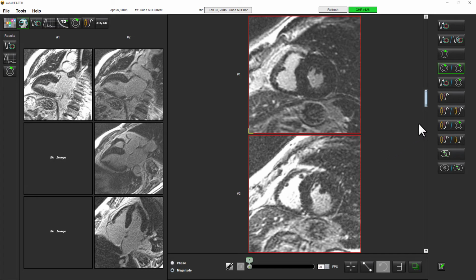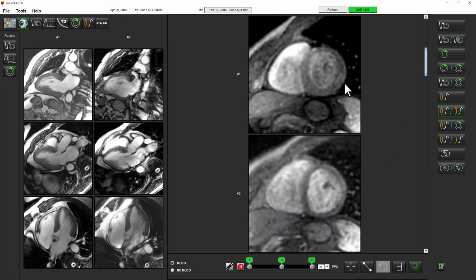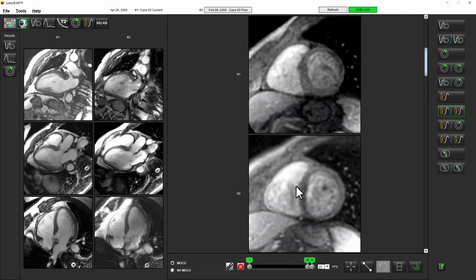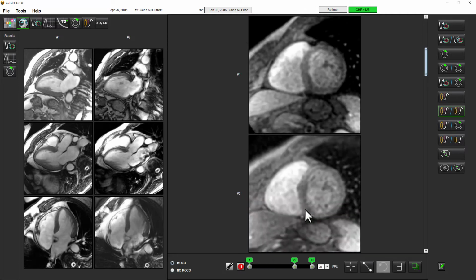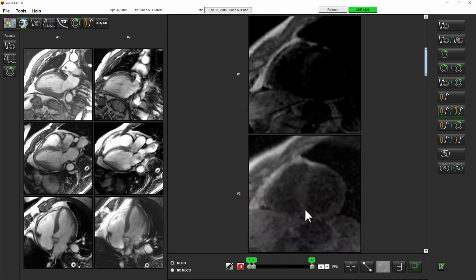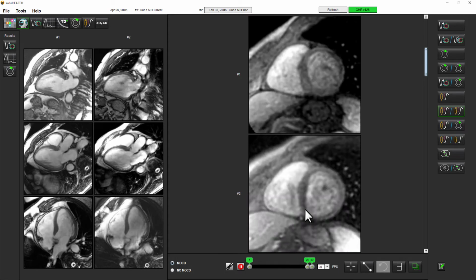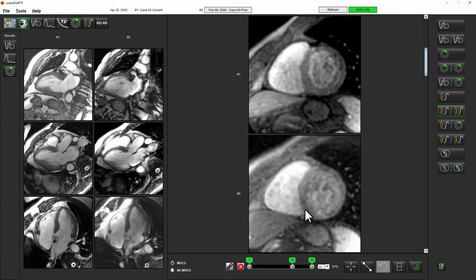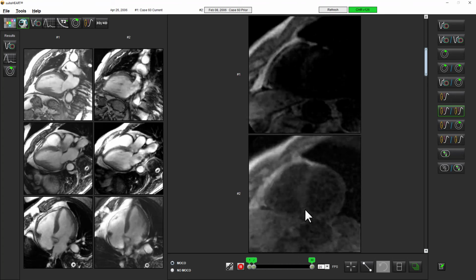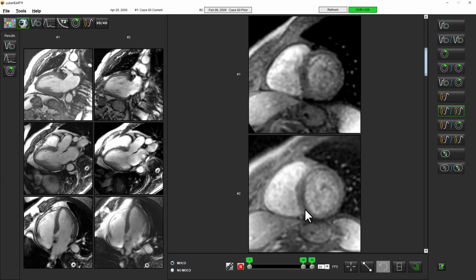And you could do that as well for perfusion images and compare the perfusion image from the current study to the perfusion image from the prior study. So I hope you can see how Virtual Fellow can save you a tremendous amount of time by presenting the images in a standardized format and allowing comparisons to be made much more quickly, either between series of a given exam or even between different exams. Thank you very much.